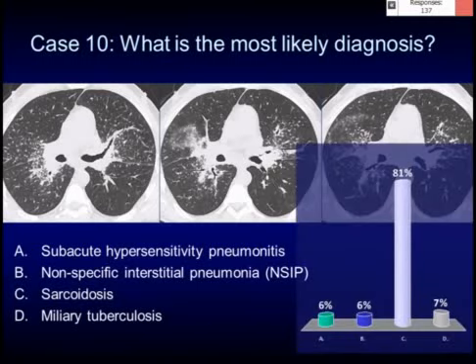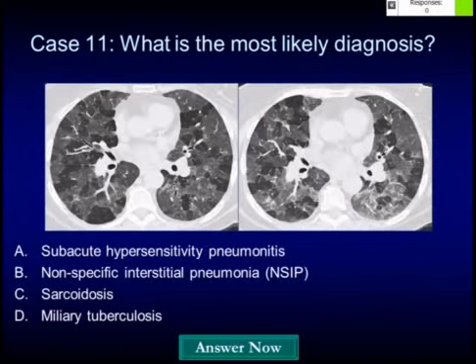Great. So here we had, back to a micronodular pattern, too numerous nodules to count. Clearly, the nodules look like they are involving the perilymphatic structures. Moreover, they are clustering along those areas, as Rob talked about. So if you look along the fissures, the pleural surfaces, and the axial interstitium, it looks like it's being riddled by micronodules. So it is a very perilymphatic disease. Moreover, these nodules are clustering in areas lined by lymphatics. So the best answer here would be sarcoidosis.